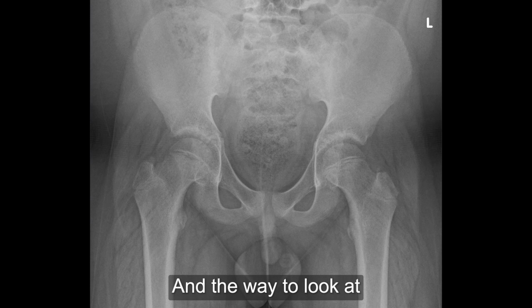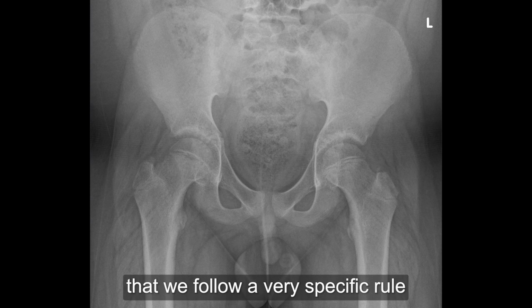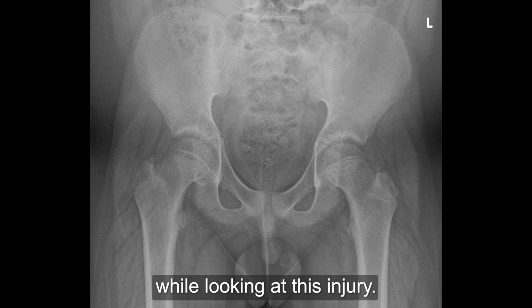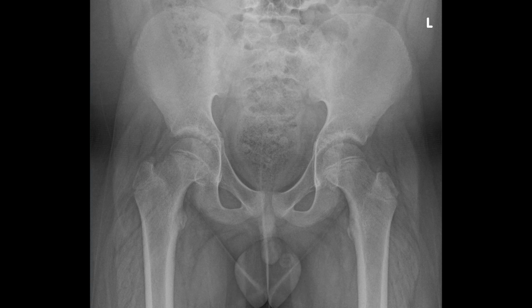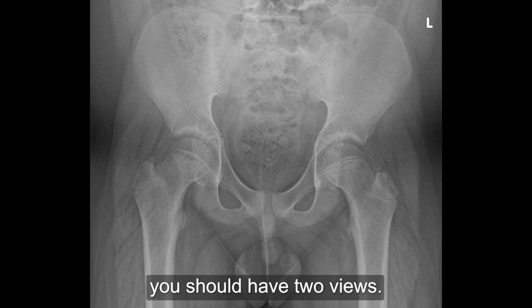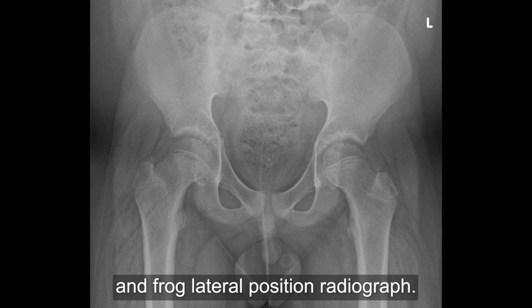It's important to detect this because it has significant morbidity if undetected and it progresses to full dislocation or subluxation. The way to look at this is we have to follow a very specific rule. And how to detect SUFE is by applying two different rules. Rule number one, you should have two views. One view is too few. We need to have an AP radiograph and a frog lateral position radiograph.